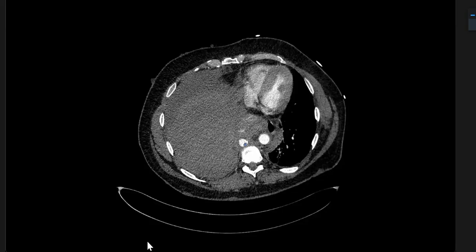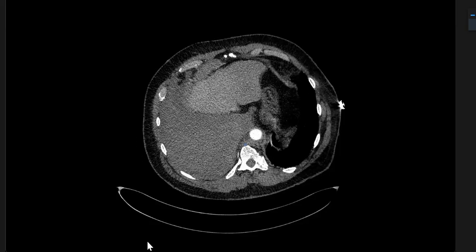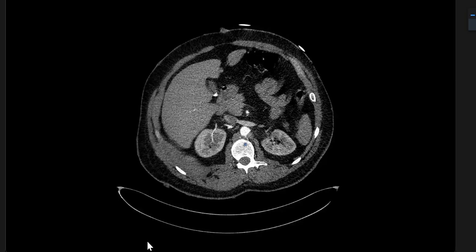So again, here there were some critical mistakes done. Collapsed lung, then lung mass, then PE. I would like to see the CTPA, although you could easily see the central pulmonary vessels. And then MDT, cancer, all things came up to your mind. But then, look at the history. History is the key. I just give you 3 words: acute shortness of breath. That's it. And that summarizes everything. So history is always key.